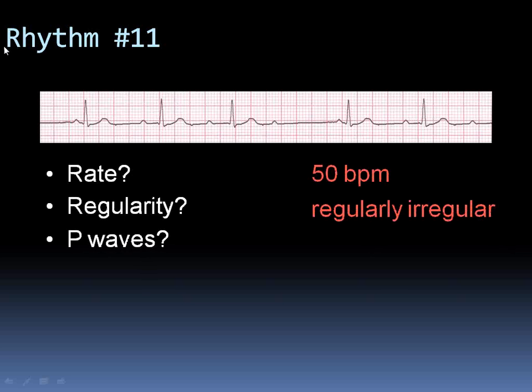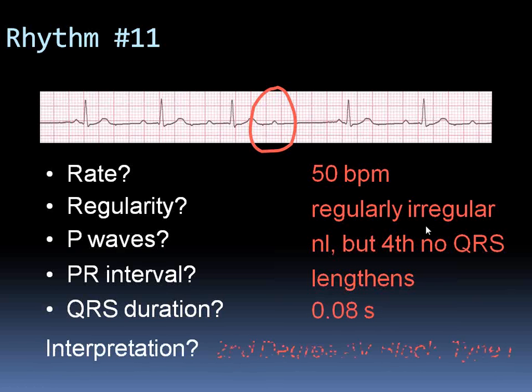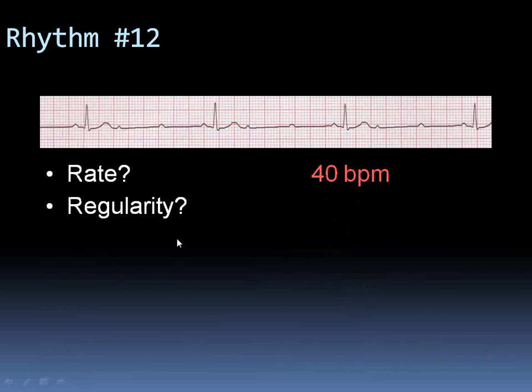When you check a pulse in such a patient, because every fourth or third P wave is not conducted, it is going to be irregular. Remember that. Not all irregular pulses are atrial fibrillation. Okay. Good. Second degree type 1. Once again, we're going to revise this. Okay. Now, what do you think is going on over here?